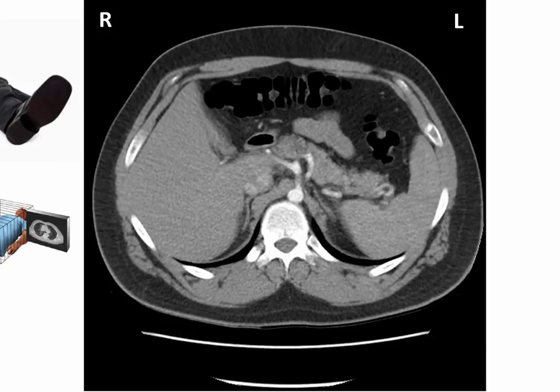The inferior limit of our thoracic cavity is the inferior thoracic aperture. Posteriorly, this is at the level of the T12 vertebrae, here. It is articulating with the head of the 12th rib, here, at the costovertebral joint. At this level, we can also see the liver, the spleen, and the pancreas.